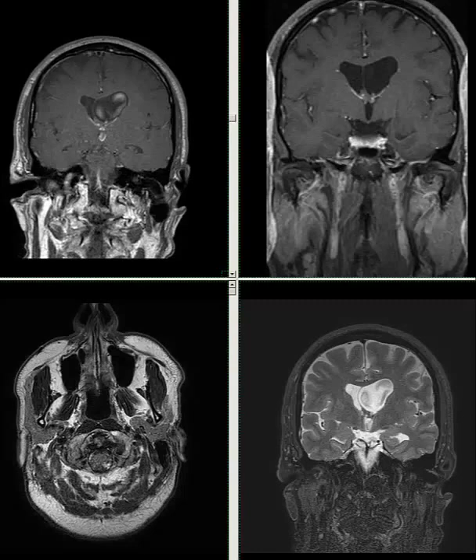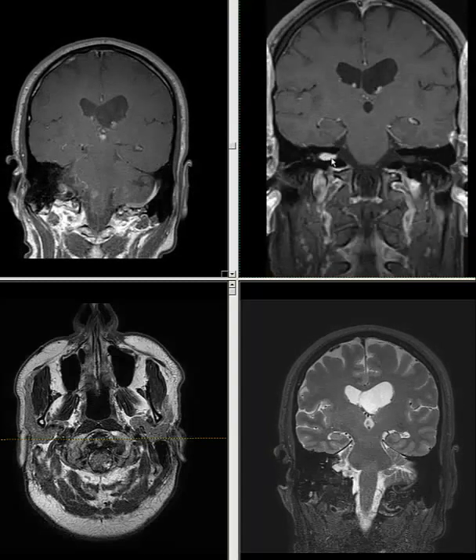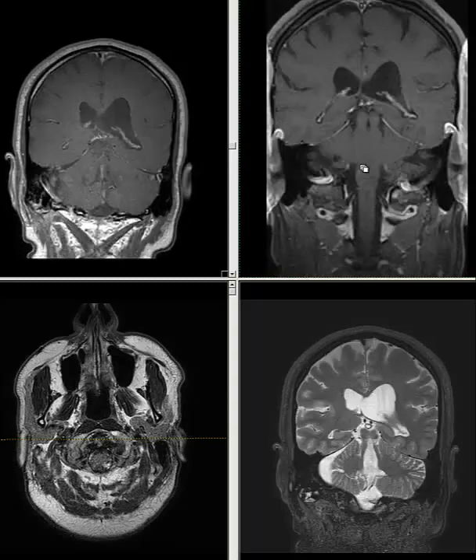This case is an interesting case for CSF disturbance. This is a 50-some-year-old male patient that had an acoustic neuroma in the right side internal auditory canal that has been there for several years. The upper right corner is the 2011 MRI, and in the 2012 MRI it is getting even larger, protruding into the CP angle. That resulted in a surgery.